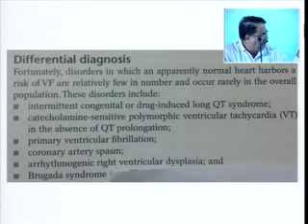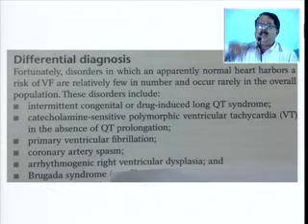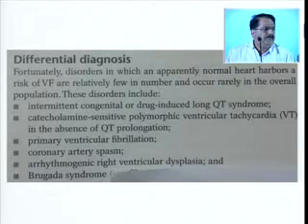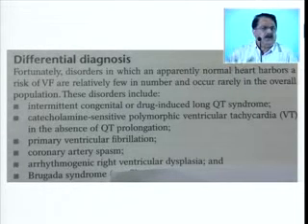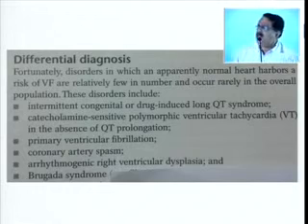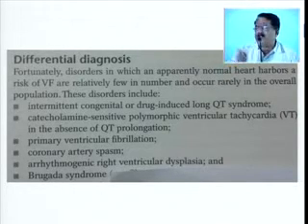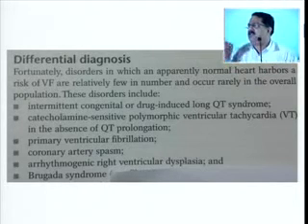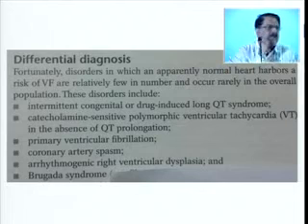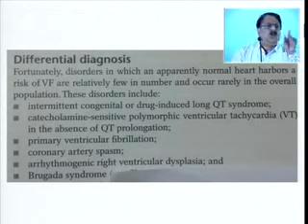Now, somebody asked about coronary spasm. With the marked ST elevation, within half an hour the ST segment has become normal. Is it an MI? In the present scenario, you can immediately say, if you have an echo machine in the ICU or in the casualty, it's a 1 minute job. If you have marked ST elevation, do an echo.